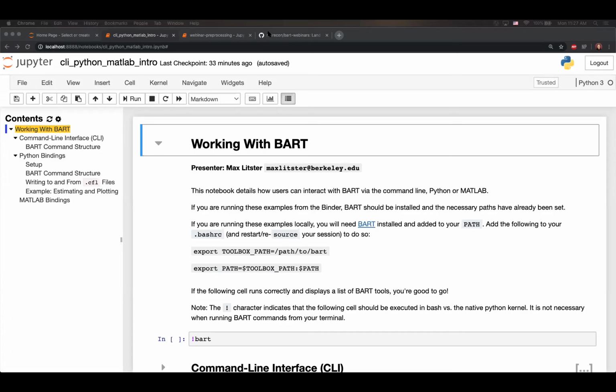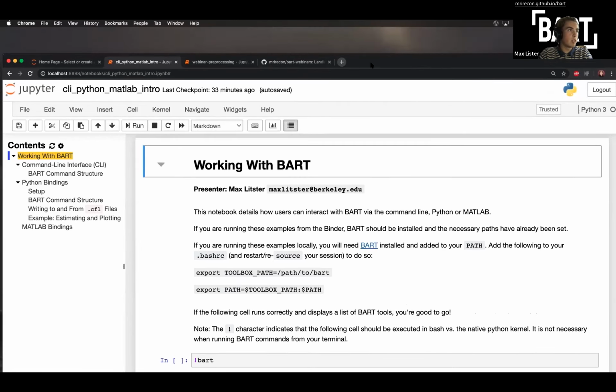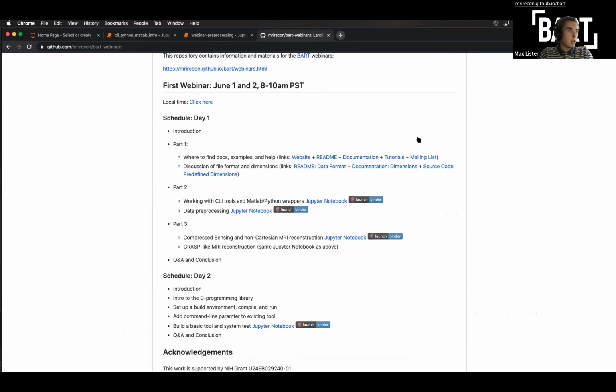Hello, everyone. Thank you for joining us for this webinar. In this notebook, I will be demonstrating some of the ways that you can interact with BART through the command line, Python, or Matlab. So you can follow along on GitHub if you want with the first binder link to show you on the web page. We are here working with command line tools and Matlab and Python wrappers.